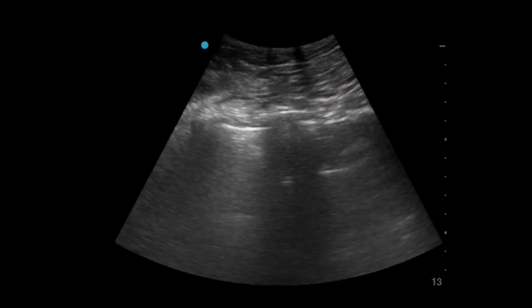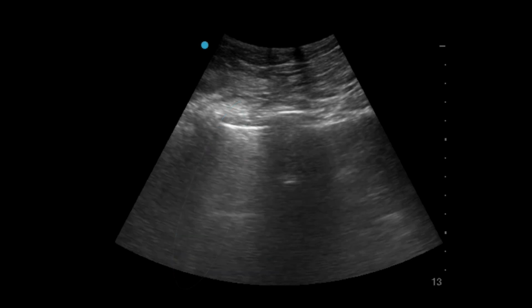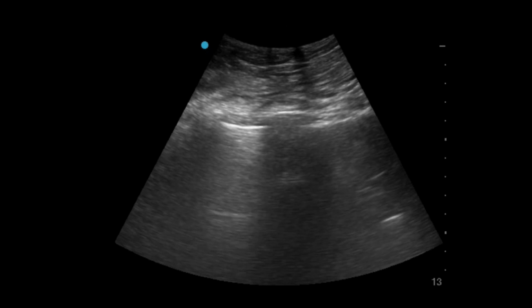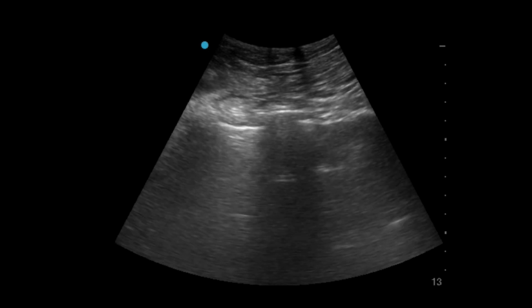The presence of B-line artifacts on lung ultrasound is much like the presence of white areas on a chest X-ray. You know something is there that shouldn't be, and it's often the distribution that suggests the underlying cause. There are other vertical artifacts, called Z-lines, which can appear similar to B-lines. They don't usually extend the entire field of view or move with the pleural line. It's unclear exactly what causes them to appear, but they're quite common and of no clinical significance.